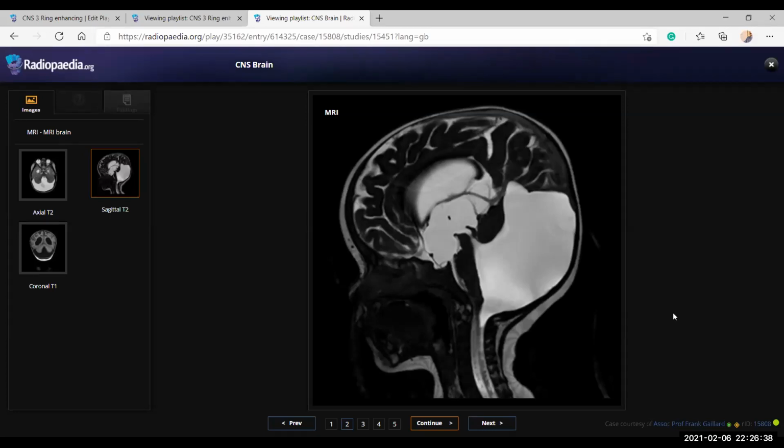This could be an aqueductal stenosis association. So this is a case of posterior fossa cerebral malformation, a classic case of Dandy-Walker malformation with supratentorial hydrocephalus and aqueductal stenosis. I will communicate this finding to the pediatric neurosurgeon for the shunting.